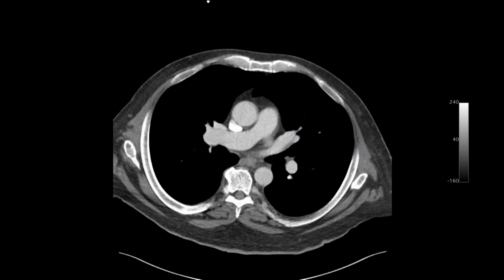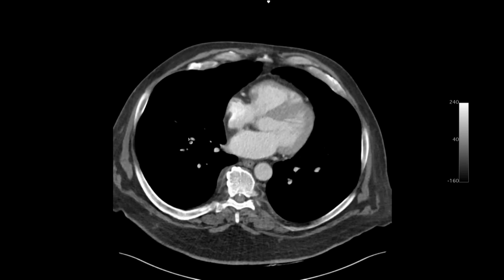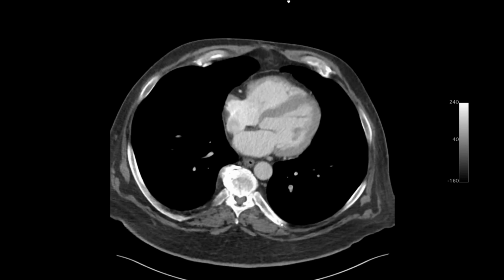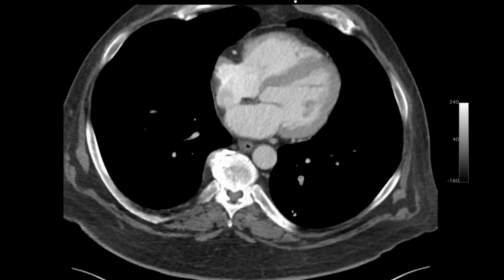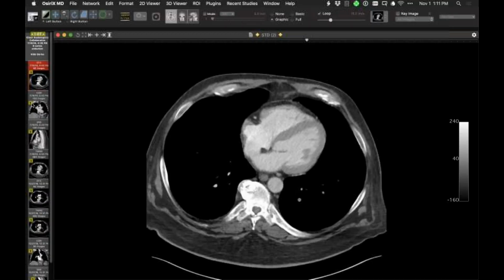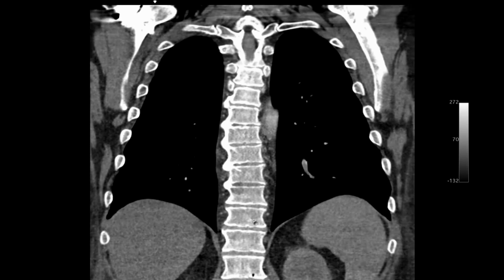And we've talked about this before, and I really discourage that because you can certainly diagnose PEs at less than 200, and I think it's fine. And here's a nice example where indeed down here one can confidently diagnose this PE. So you see it there, and I need to show you maybe a better one, like a coronal of that. But it's easy to diagnose that kind of embolus with confidence.